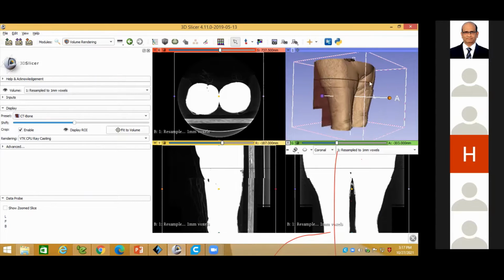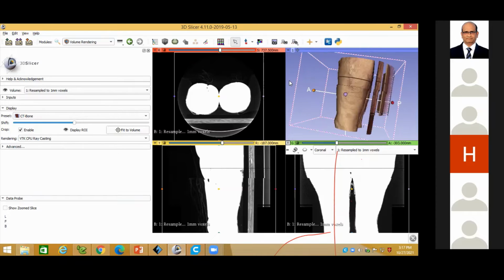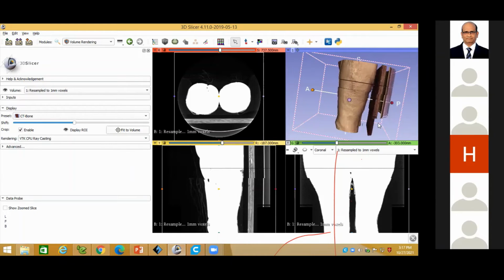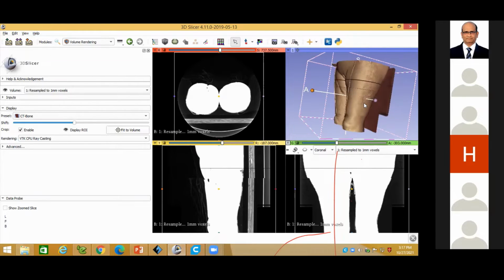When we are lying on the CT scan bed, you can see these are the tissues, this is skin. This is my CT bed. When we move during the CT scanning, the bone information also moves when the CT images are extracted. That's why they insist that you don't move your parts. So this is one defect here.